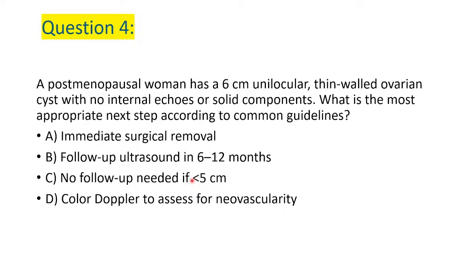So all these cysts, they should be followed up. So the correct answer is follow-up ultrasound in 6 to 12 months. That's the recommendation that you have to give when you see such a cyst. Yes, postmenopausal, and it's non-cancerous, it's benign. So you just have to follow up in 6 to 12 months.